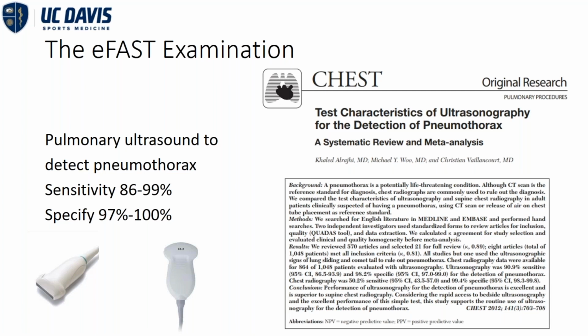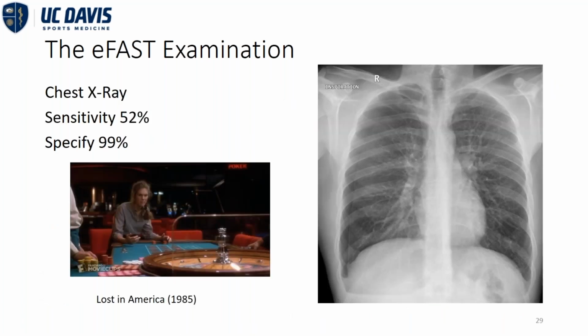Now we'll go over a couple of patient populations where you can have some false positives, but if we're looking at athletes and doing sports ultrasound and sideline ultrasound, it's darn near 100% specific. What about our good old chest radiograph?